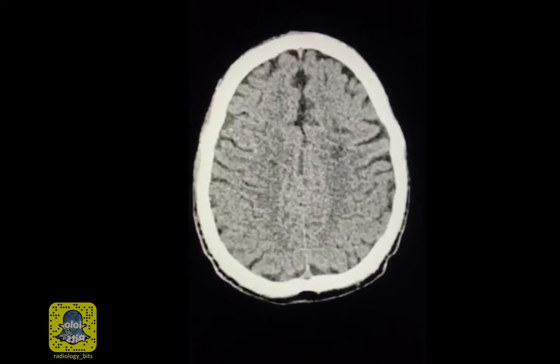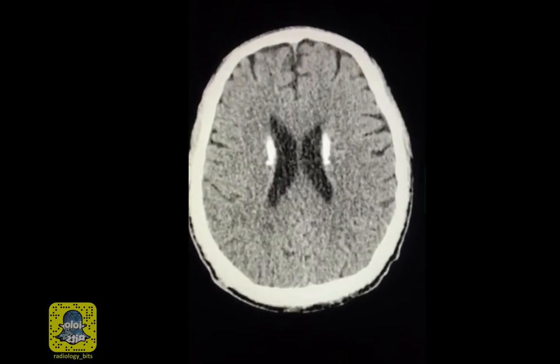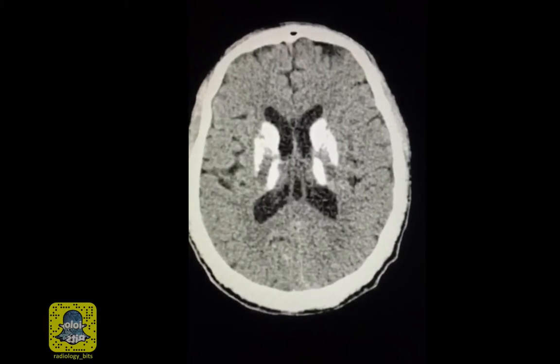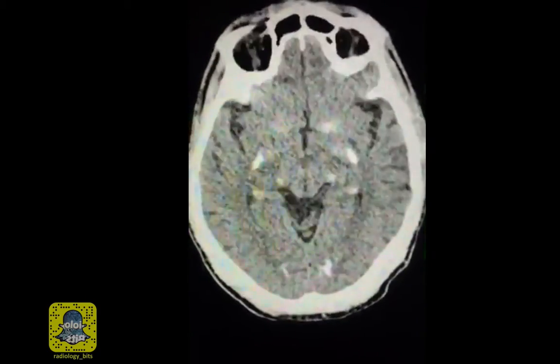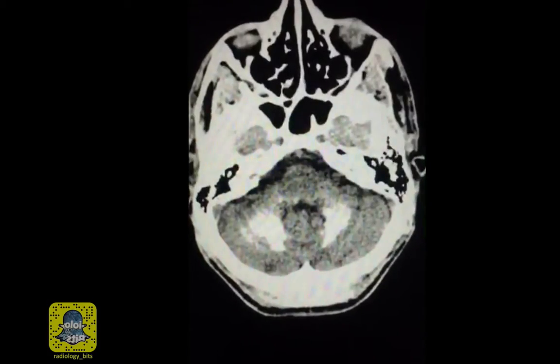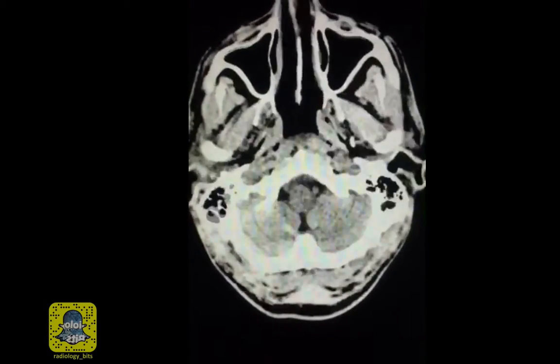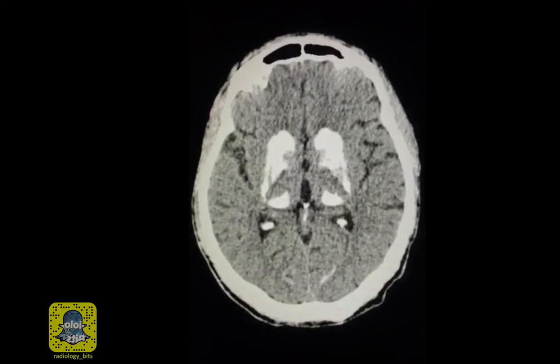This is a 49-year-old male patient who's diabetic, presented with confusion and a CT to rule out stroke. The CT you're looking at is a CT without intravenous contrast administration. This is a good case for radiology residents and people interested in neuroimaging. However, juniors would get something or two out of it.